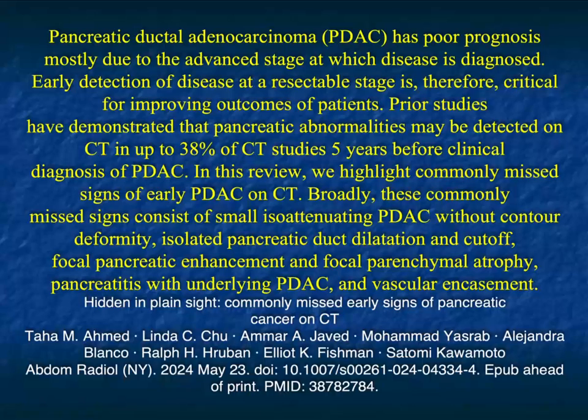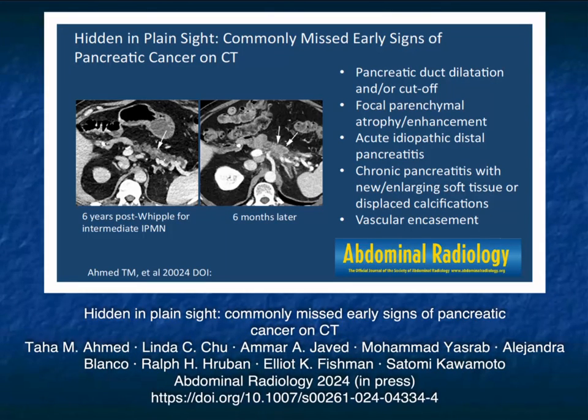And then, of course, staging. Arterial phase, looking for staging at the celiac, the SMA and its branches, GDA, hepatic artery. We also want to look at the venous side of things, looking at portal vein, splenic vein, and SMV.